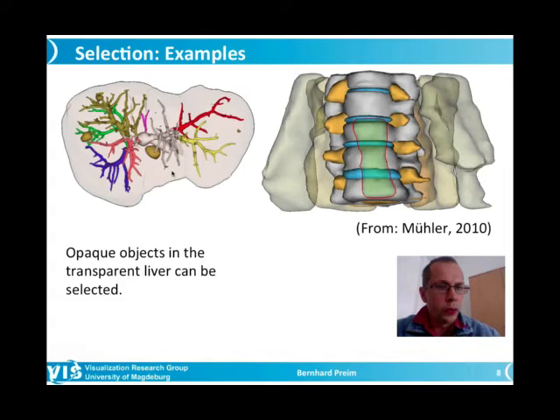Where could it fail? We thought about this, of course, and here's an example where it could fail. You may recognize these anatomical structures as well. That is the spine with all the different components that it has, the prolapse here in between. And here is a region that was specified by a physician as an area where he wants to look in more detail. So that is a user-defined additional object. Here are some muscles and so on.